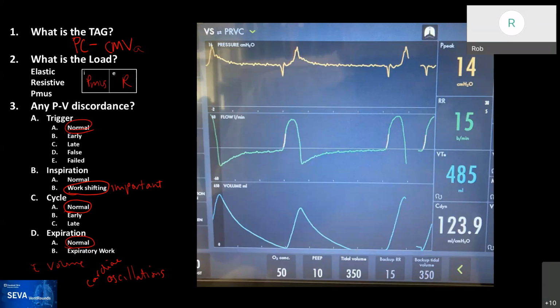Furthermore, we see two different peak inspiratory flows, two different peak expiratory flows, three different tidal volumes. And if you look close enough, the two breaths in the middle that are fairly clear have two different inspiratory times. Okay. So those two breaths in the middle with two different inspiratory times probably are spontaneous, not mandatory, right?